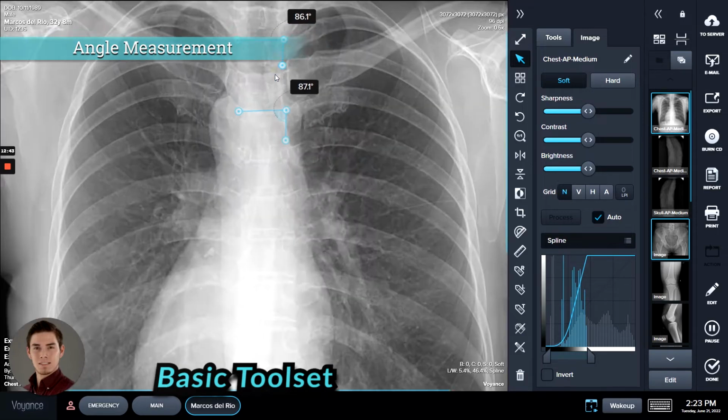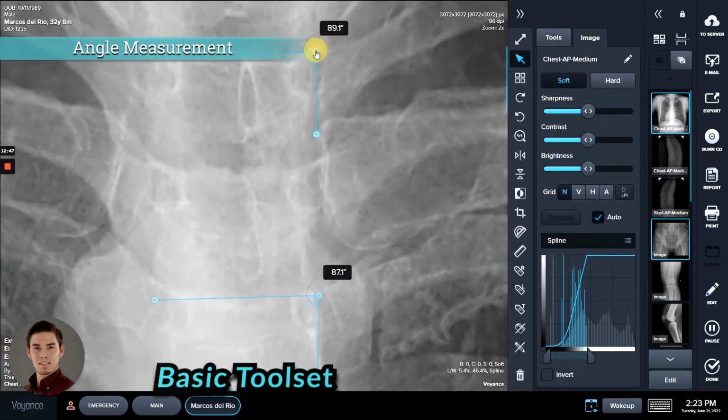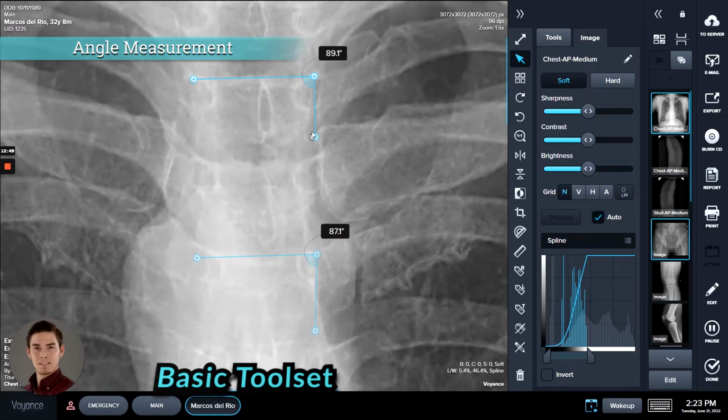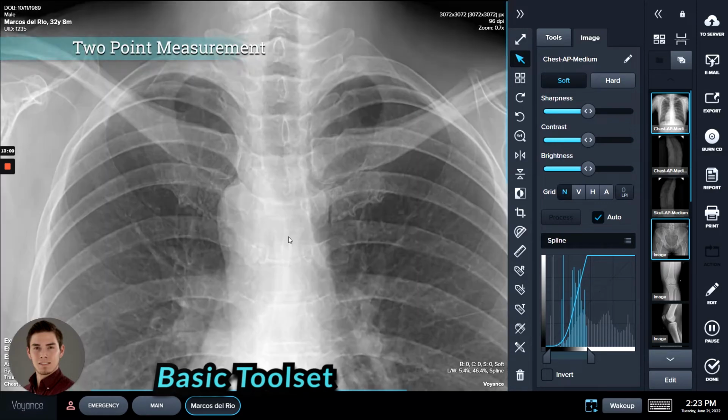Say we want to just get more finite detail here. And then to get rid of anything that we've put singularly, you just select whatever that was in selection mode and then hit delete. Select and delete. And we'll go back out here.